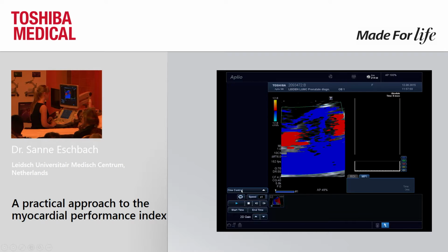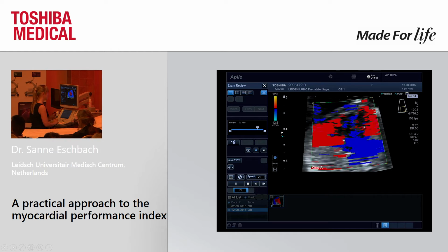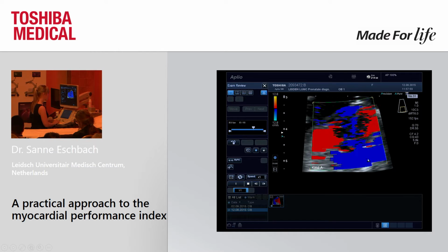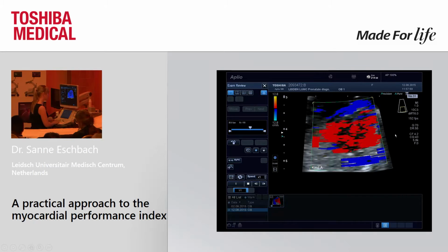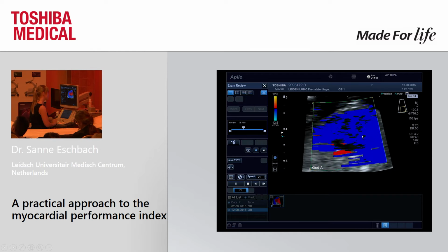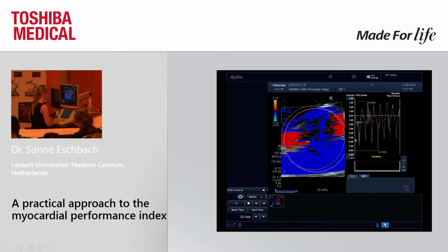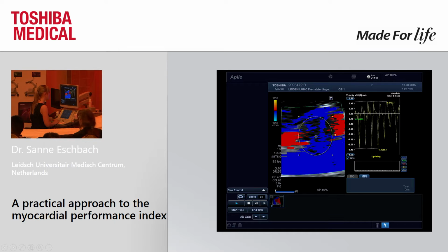So again, let's first define. It's difficult for you to see, but I know the case. Here you have the spinal cord. Here it's the ribs going, and there's the abdominal side. This is the right side of the heart. This is the left side of the heart. So I always start with covering the whole, the global heart, as shown here.